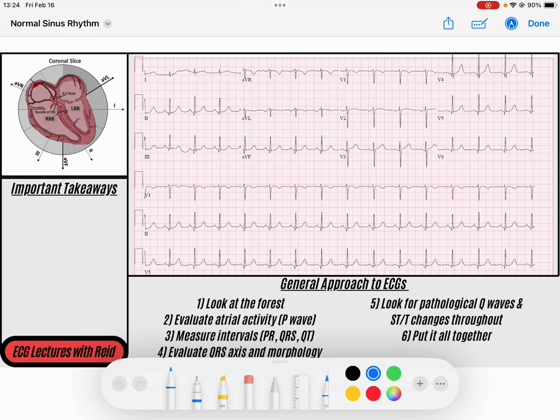This will help you understand how to master what you would expect to see on a normal ECG and normal cardiac electrophysiologic behavior, so that whenever you apply these steps and a fundamental understanding of the normal sinus rhythm to ECGs that are deviations from that, where you have pathology, then you will ideally be able to identify the physiology associated with that ECG strip, right? And that will help tailor and help you understand your treatments and response to treatments and everything.